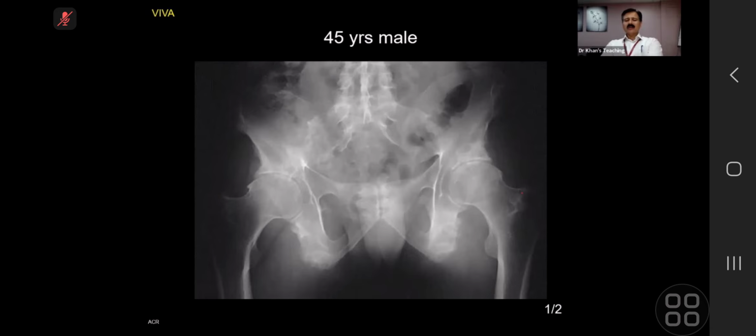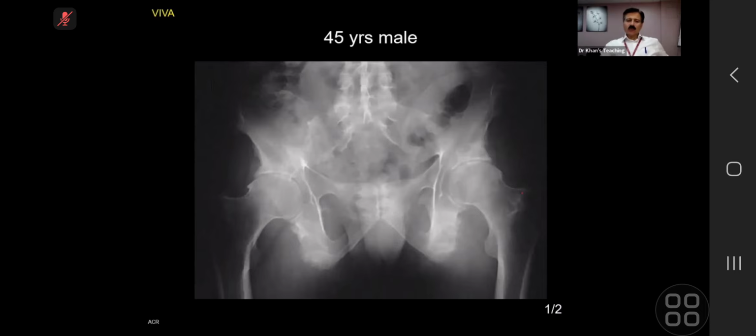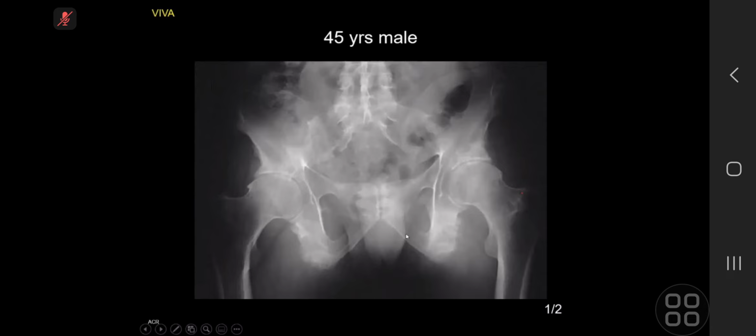Okay. Well, there's also prominent enthesopathic change. Excellent. For example, at the underside of both inferior pubic rami, at the inferior and superior iliac spines bilaterally. I would like to assess the SI joints, but I can't see them very well. Excellent. So what is your conclusion? So I wonder if the reason I can't see them is because they're quite severely diseased. What do you mean diseased? As in there's an erosive process occurring at the SI joints bilaterally.